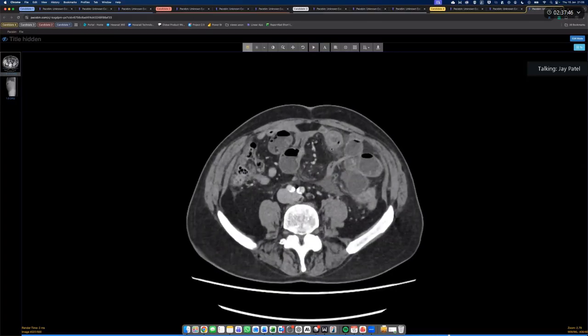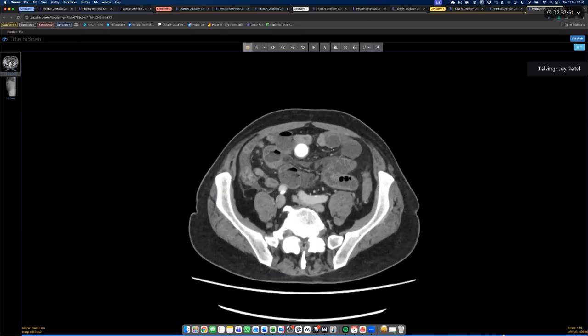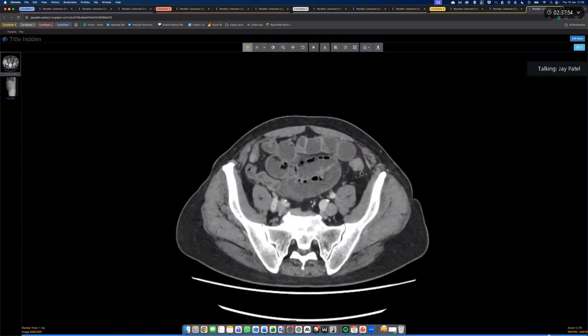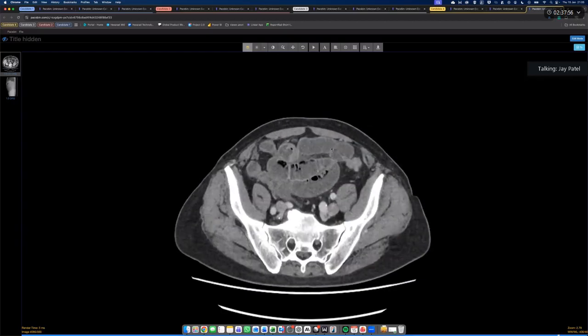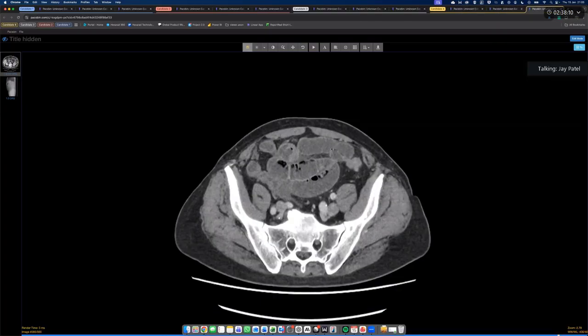Now, as the gallstone has passed through, either of two things has happened, don't know. Either the gallstone has passed through and intermittently damaged the bowel wall as it's gone through, gotten stuck, lots of peristalsis against it, damaged the bowel wall and managed to get through, but left a bit of damaged bowel. Or this patient has had small bowel obstruction secondary to the gallstone to such a degree that they are now compromising their bowel. And that's what I mean by always look for ischemia, always look for perforation, always look for any kind of what I call compromise.